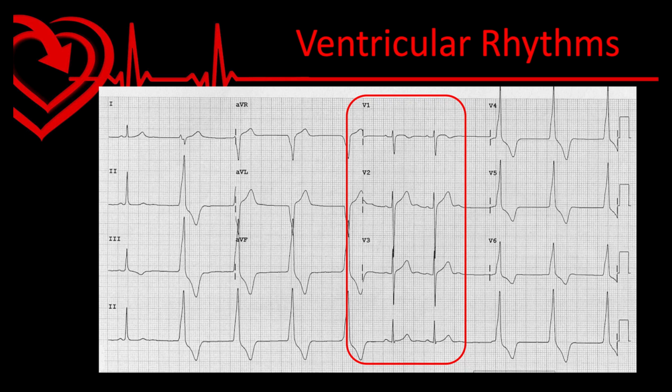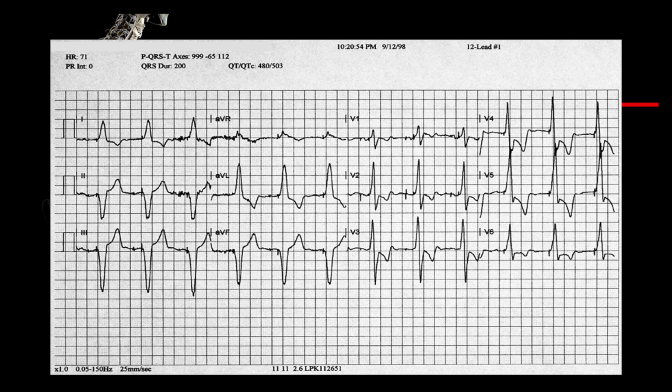Based on what I said in an earlier video about needing a good, clear cardiac cycle in each of the 12 views, this 12 lead is really not useful at all in terms of making any sort of significant interpretation, but it's easy for our eye to get drawn to the big dramatic ST changes that come when there's a big dramatic QRS.